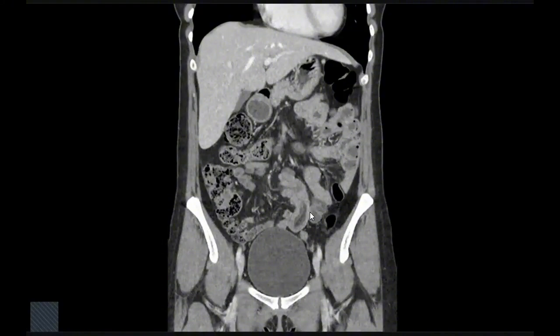So what is the complication of intussusception? Ischemia of these bowel loops. But I can't see any sign of decreased enhancement of the bowel wall. So no need for emergency? No, it's an emergency because it may develop later on. So yes, we'll urgently convey the finding, pick up the phone and urgently convey the finding to the referring clinician, and the finding will be discussed by the surgical team.